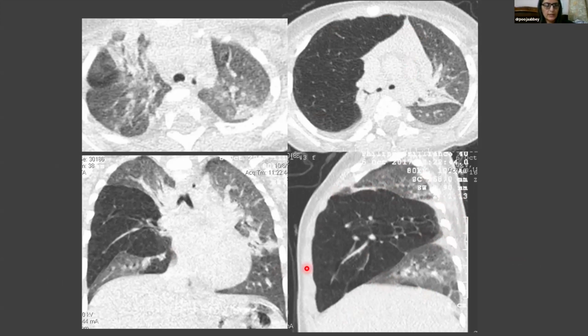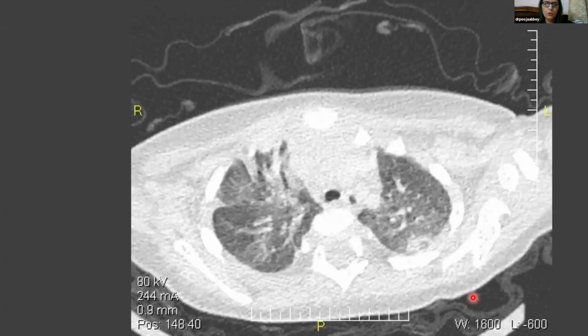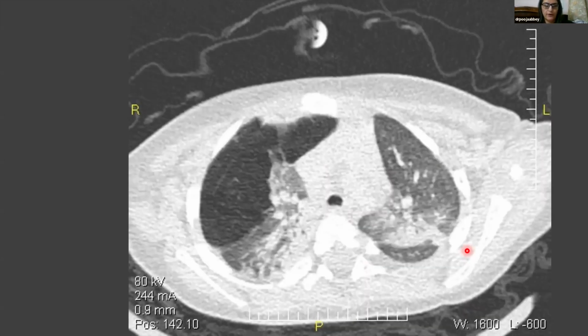So what does that make this to be? This looks like the right middle lobe. So there is hyperinflation of the right middle lobe, which is seen here. Let's look at a few more images now. So going above downwards. So that's the trachea here. And what is all this? These are probably patchy areas of collapse, which are seen because of the mass effect.